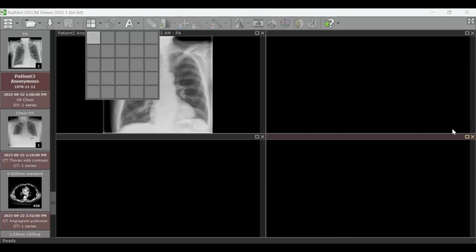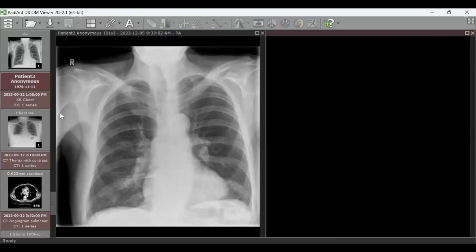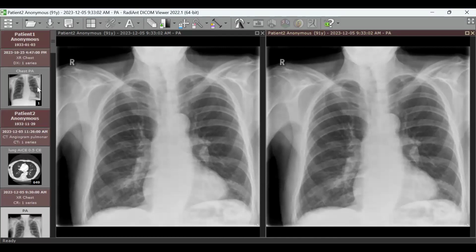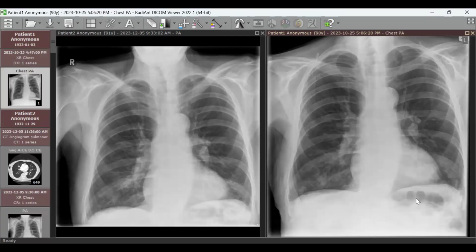So, by the way, this X-ray was reported normal. When I saw it, I didn't agree with that, and I wanted to go back and see. Let's see, I think we have an older one, yes. So this is the older X-ray, just 2 months before the one we have right now. The abnormality doesn't exist in the previous one. Exactly. See here, the opacity is here and continuous with the vessel.